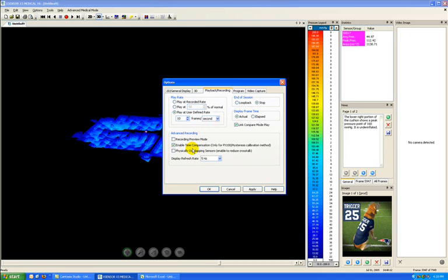So when two sensors are attached to the same system, and they may overlap, they may have what we call crosstalk or interference with each other. But telling the computer that they are overlapping can eliminate some of these effects. We can also display refresh rate changes, so we can make it a higher or a slower refresh rate as we play it back and as we record.